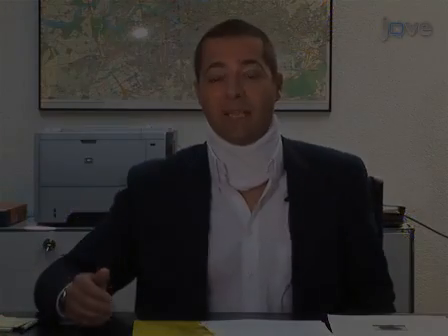We first had the idea of this technique when we realized that the gyrification index that has been used in comparative neuroanatomy for decades could be a very powerful indicator of brain development if we could overcome the issues in the way it was implemented. The method will be demonstrated to you.